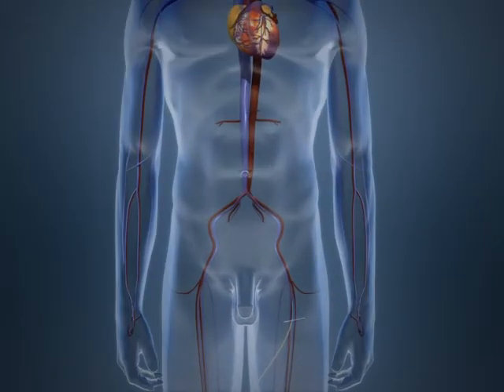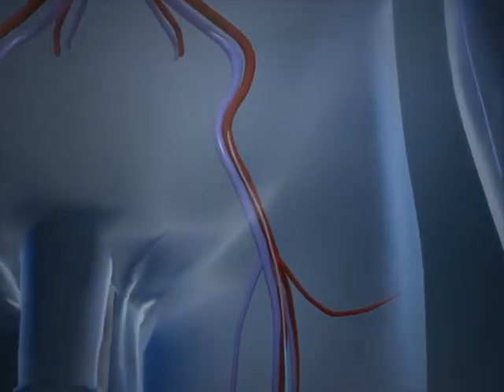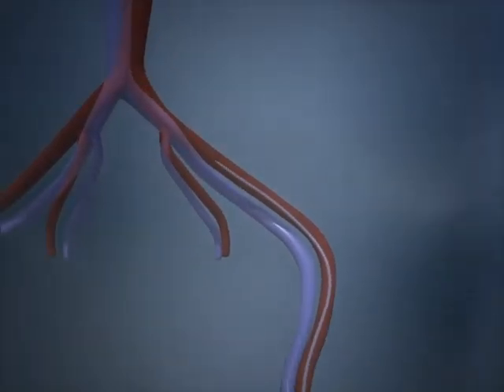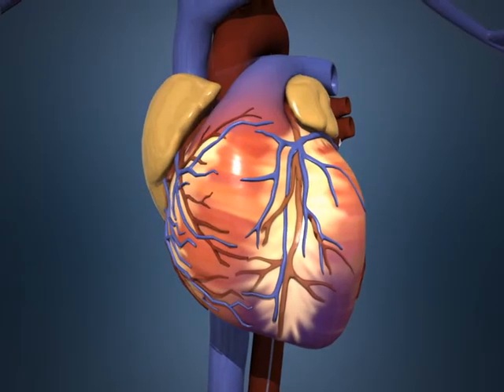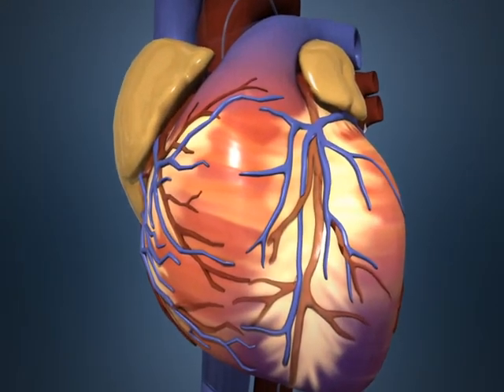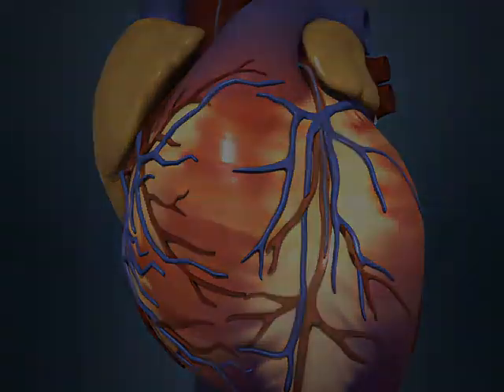Thanks to the quick exchange design, the catheter can be moved simply and quickly. The use of the Amicath is indicated in cases of primary angioplasty when the flow of the responsible artery is TIMI 0 to 1.